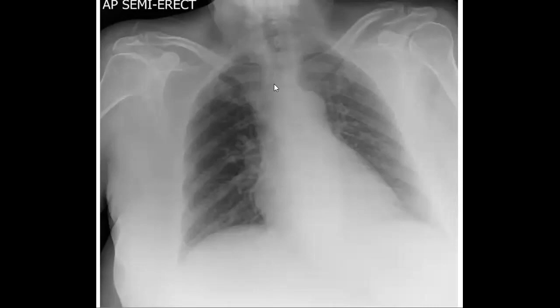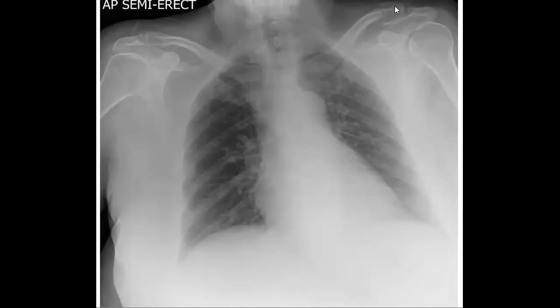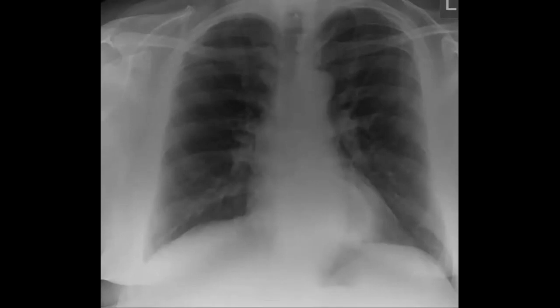If you go to check the bones, yes, Hiba, perfect. So this left clavicular fracture, perfect. Yes, nice, here. Distal clavicular fracture, one of the checklist items in rapid reporting and also in the short cases. Yes. What else? What do you think? Eagle eyes.